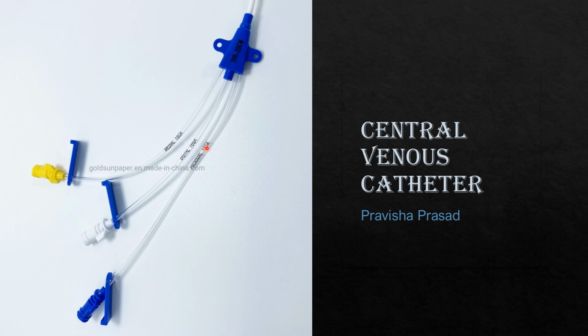So that is the proximal port and the proximal port is mainly used for blood sampling, medication administration and for infusions. We can use this for infusions, medication administration and blood sampling because it has easy access to the blood. So we can use it for blood sampling.